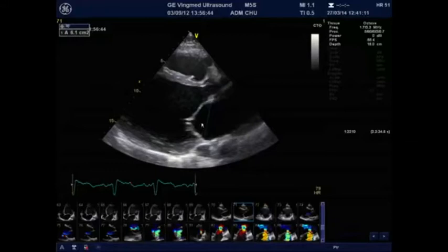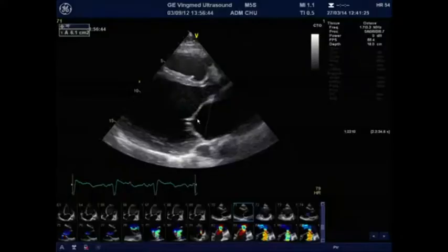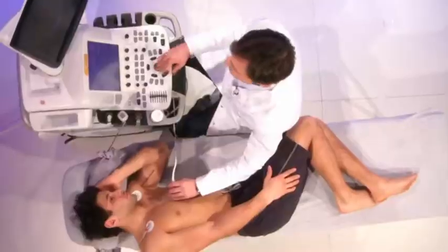mitral valve. The normal value should be less than 2, and in these patients, if we have more than 2 to 3, this is associated with a high likelihood of recurrent mitral regurg after any kind of valve repair in this patient. So if we want to continue the analysis of the deformation of the mitral valve, there are 3 parameters that should be taken into account.